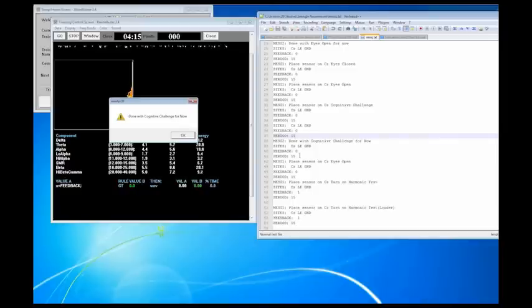Now, we are coming up with a brand new system that's going to basically be able to do all 5 of them at the same time and pull that out so we can put it in something else. That is going to be in the BrainAvatar software, one of the reasons that I'm not showing you with the BrainAvatar software right now. But yeah, the beauty of the Discovery is it already does more than 4 channels. So because of that, you just have to go through these little pop-ups right here, but you don't have to switch off sites or anything like that.